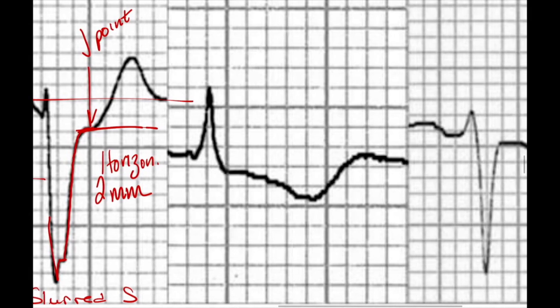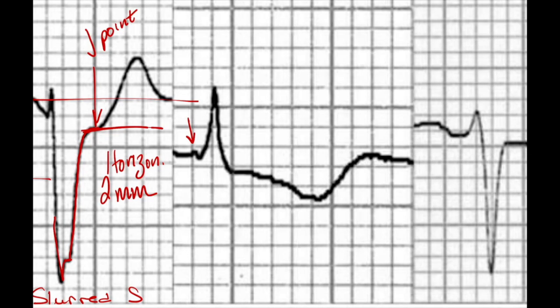If we go to our next example, here's our P wave, here's that R wave, here's that negative deflection, and we see here we flatten out. So there's our J point, and it looks to be a little downward sloping. And we have just about a little greater than 0.5 millimeters of downward sloping ST depression.